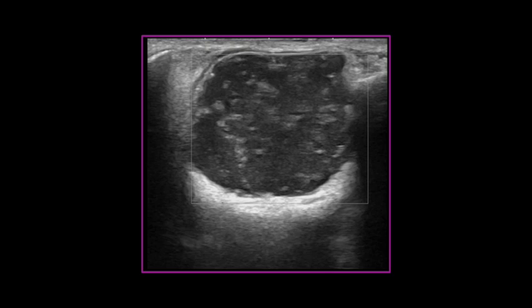Dermoid cysts are also found arising near ovarian tissue. As you probably remember from histology class back in medical school, dermoids arise from multiple layers of germ cells that produce conglomerations of developed tissues such as hair, teeth, muscle, endothelial tissue, etc. A characteristic finding within dermoid cysts is a Morse code-like pattern of dashes and dots.